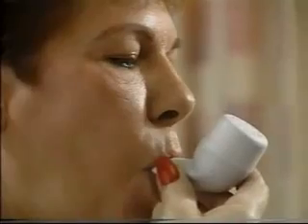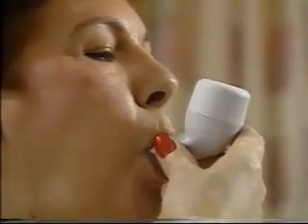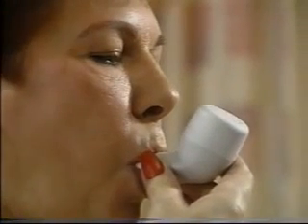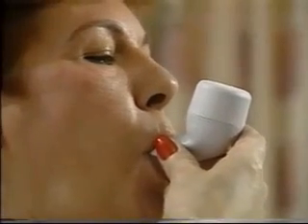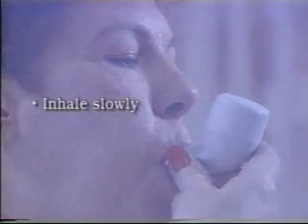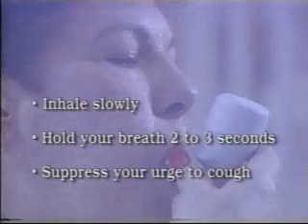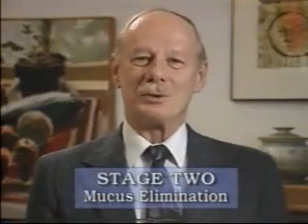Repeat the breathing technique for 5 to 10 breaths to loosen and mobilize as much mucus as possible from your airways. Each breath through the flutter moves the mucus further up your airways. Remember, during these loosening mobilization breaths, it is important to inhale slowly, hold your breath 2 to 3 seconds, and as you breathe out, suppress your urge to cough. Now you are ready for stage 2.